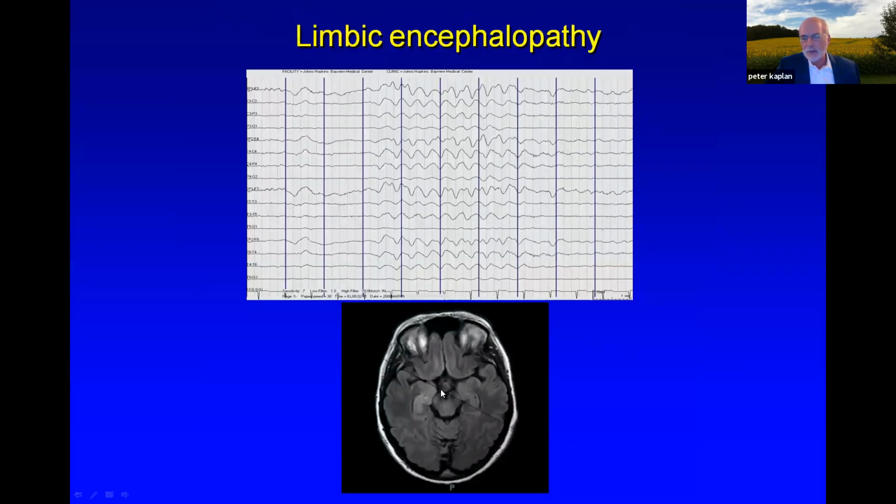In limbic encephalopathy with this pattern here, you can see bursts of bilateral delta that I showed you before, and that's probably a reflection of the fact that these are deep-seated foci, so by the time it gets to the cortical surface, the spike component is not seen. You can see it in some patients with the extreme delta brush or even spikes, but often you won't.